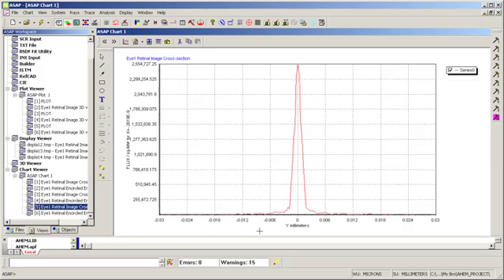So in summary, we took an aberrated eye with axial myopia and ran ASAP's optimization process using the sphere of a corrective lens as a design variable, and then we used a design objective of full width half max, and we tried to drive that to 0 because we want this half max full width to be as minimal as possible. And we ran that through the optimization, and it gave me a number of minus 1.65 diopters to put onto my corrective lens.